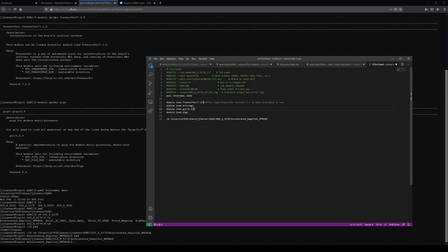And then all of that, changing into a directory, this changes directory to the indicated path. It's maybe more descriptive than you need to be, but it can be helpful. It doesn't hurt to be overly descriptive on this. And I won't do more commenting just to save some time.